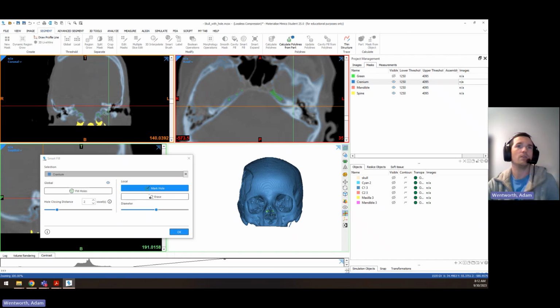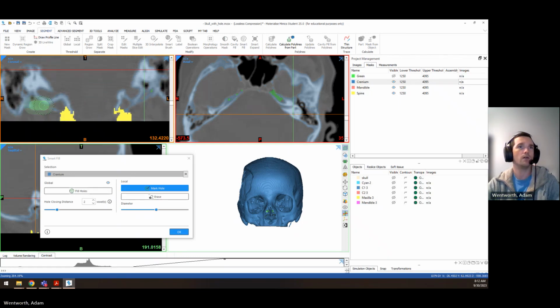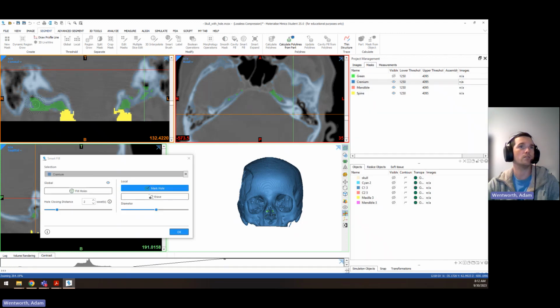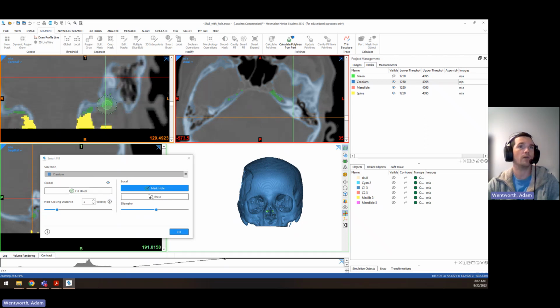So from here, it's very helpful to know what the normal shape of the bone is, so I can look at it in 3D and say that's right or that's not right. And here you can use those cortical bone edges as a guide. Here's temporal bone, so there's a lot of spongy area in there that is actually air. I'm not going to fill that.